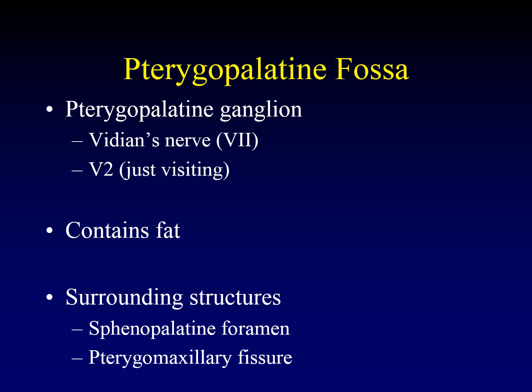The entrances and exits from the pterygopalatine fossa are complex. On the medial aspect of the pterygopalatine fossa, there is a sphenopalatine foramen that communicates into the nasal cavity. On the lateral aspect of the pterygopalatine fossa, there is a pterygomaxillary fissure that communicates into the infratemporal fossa. I know this sounds like a little bit of a word salad. We're just throwing letters together, but I'll show you some examples and hopefully it'll all come together.